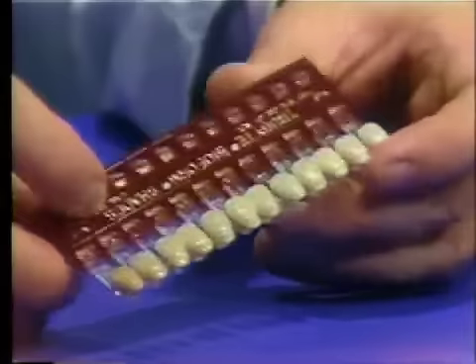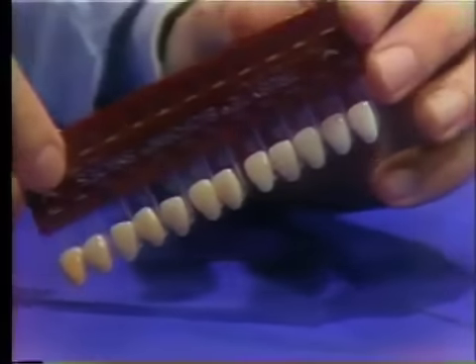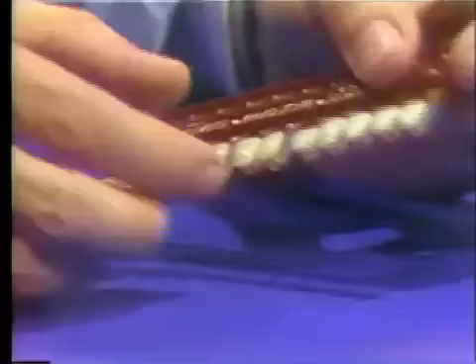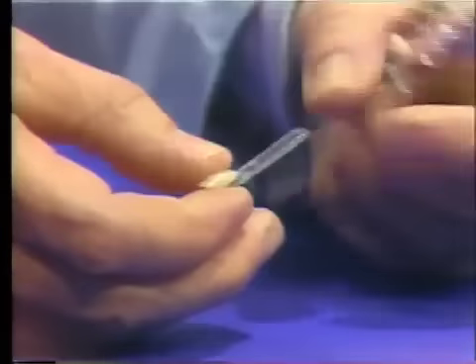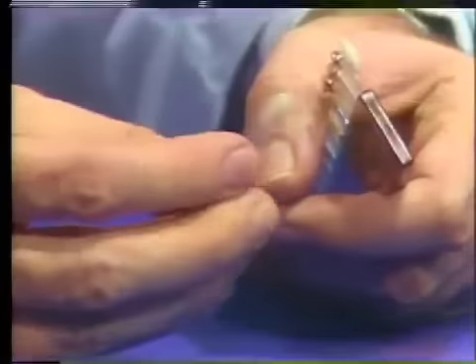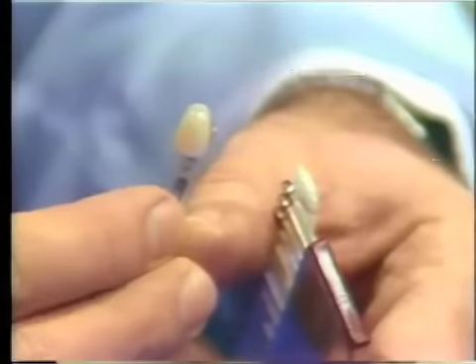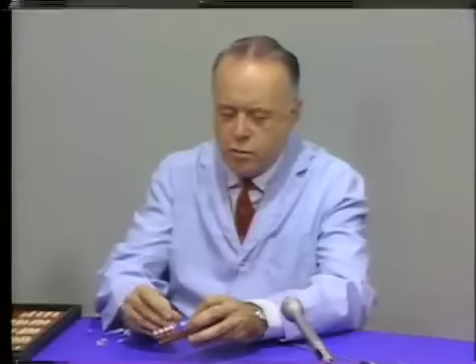These teeth are made in all the shades of the biform shade guide. This biform shade guide, running from shades 59 through 82, is utilized to select a particular shade for any patient. These, of course, are detachable in the usual manner of shade guides and can be carried into position in the mouth and placed alongside adjacent teeth so that the shading can be checked and adjusted. Once that shade number is decided upon, it is recorded in the patient's record and is available in the selection of the facings that are going to be used in the construction of the bridge.